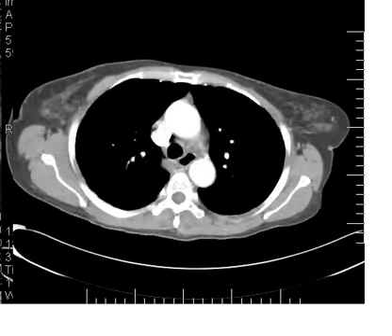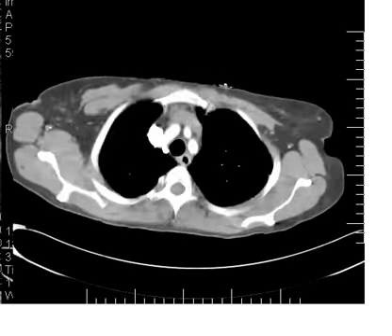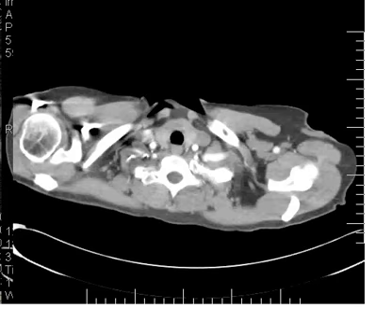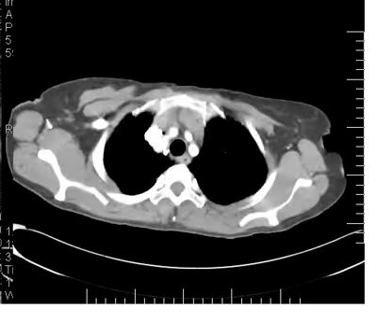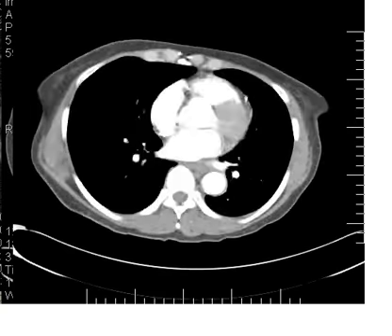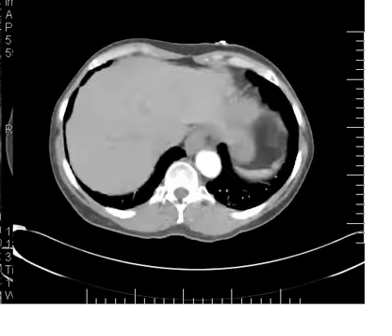Well, here we have a case which is negative, but it is designed to demonstrate the anatomy clearly, I hope. And I'm going to run through it here quickly. First, just to kind of give you an overview of what we're going to be looking at.